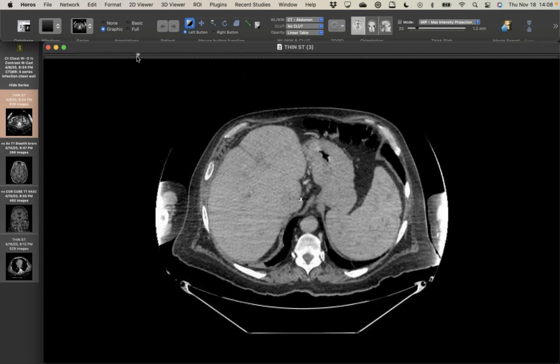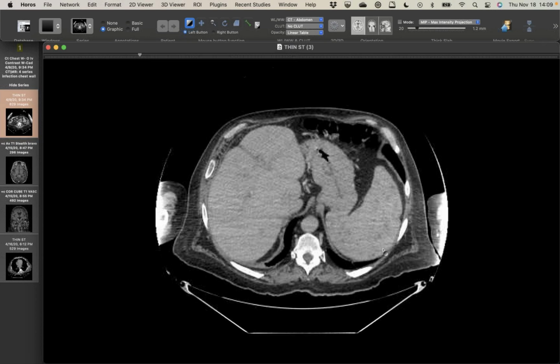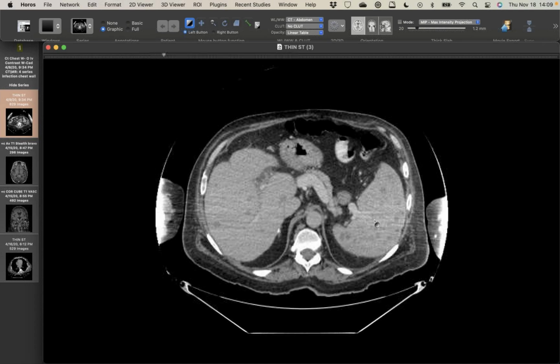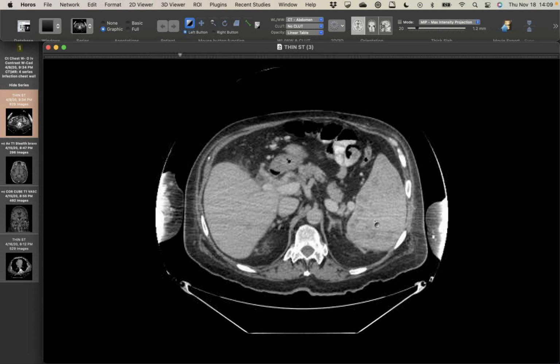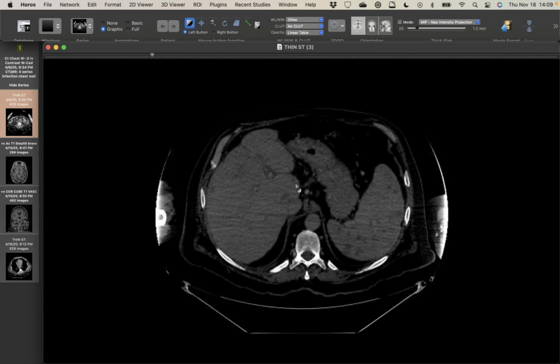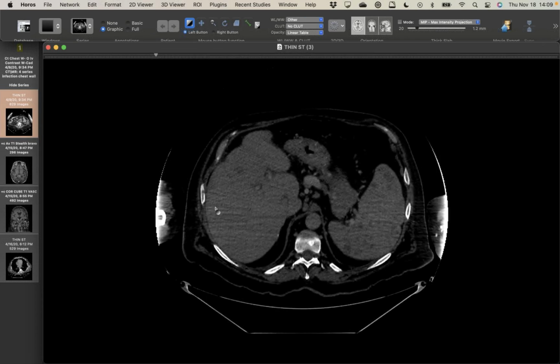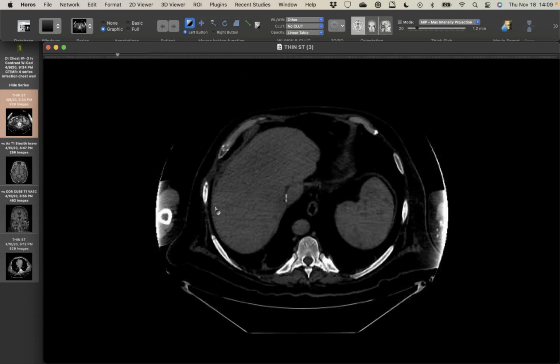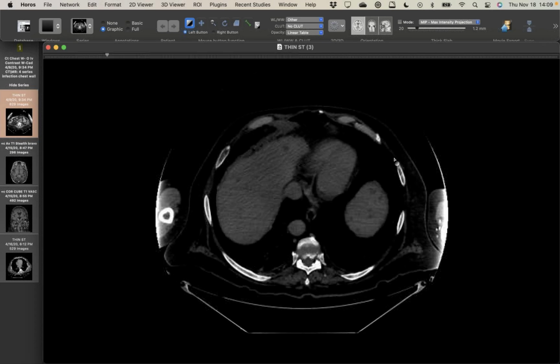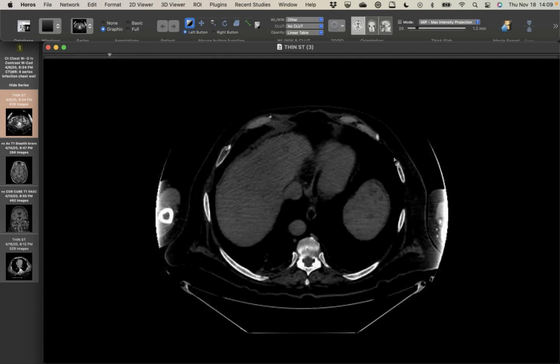So they did an abdominal CT, and they noted all of these low attenuation lesions in his liver and his spleen. And then I think there's a little bit of stranding around there, but that may just be related, yeah, in the sort of the fossa there. But what they also noted were some lytic lesions in the bones. You can see there's one there in that rib, and that's really the only chest finding of these lytic rib lesions. So of course they were worried about a malignancy, a PTLD.